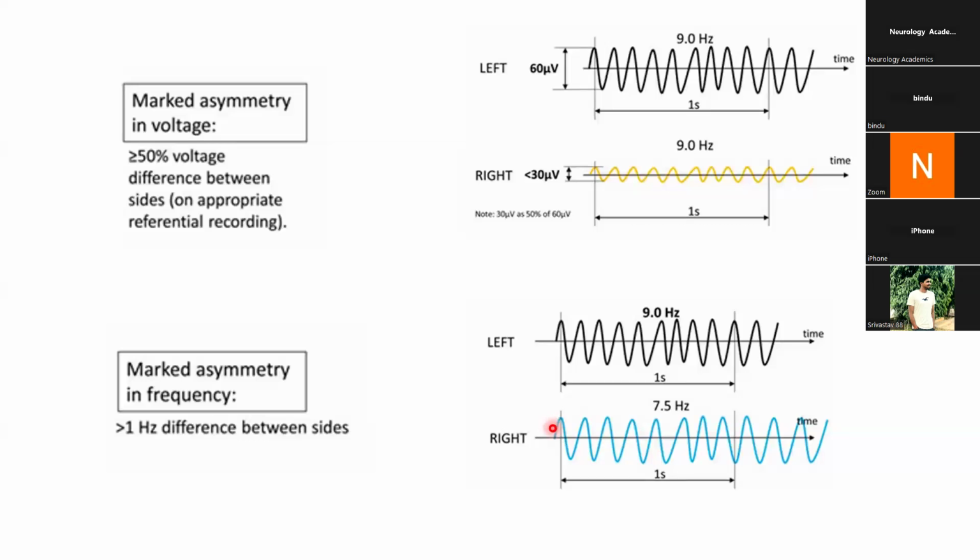So it is between the hemispheres that you always compare the asymmetry because you can't pinpoint it to one or two channels. So just have to make it mild, moderate, and severe. Compare between the two hemispheres, and it's not at all generalized. Depending upon the voltage and frequency, you can have just a look at the EEG, and it can be 1, 2, and 3. Hope you understood.